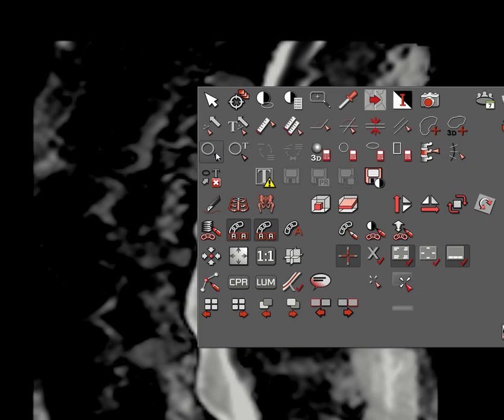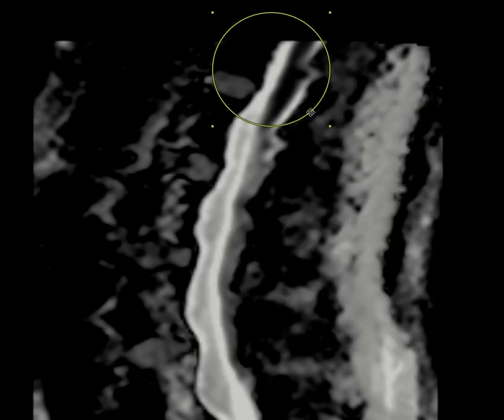So if we do restricted diffusion, although this is a very difficult technique, you're going to see some DWI bright and ADC dark areas about the cord, like the brain itself. In the brain, if you have a stroke, you're going to see DWI bright and ADC dark. So here in the area of the distal cord and conus, we see some areas of ADC darkness, like the brain. So this is another sign that this is cord infarct right there.